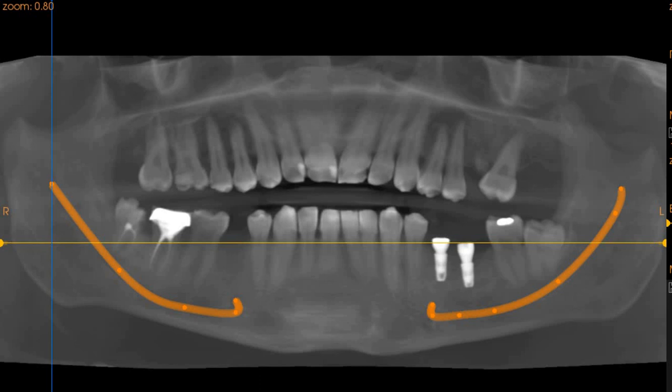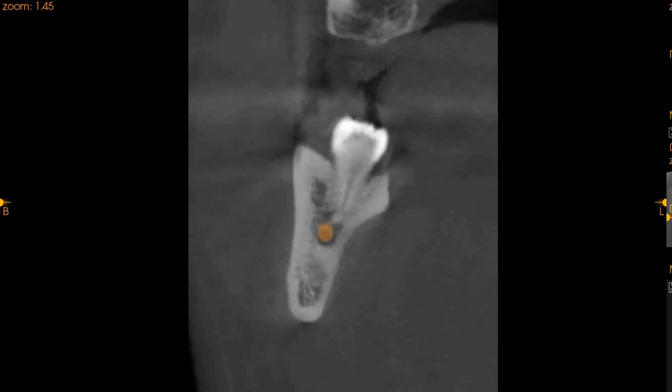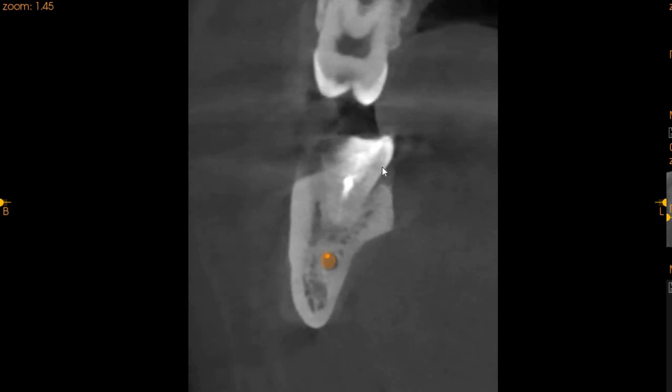Moving to the transaxial view, which is approximately the proximal view of the tooth, I'm going to zoom in for our kind doctor. Now we're going from the mesial aspect. I'm going to slide very slowly to the distal aspect. So this is the tooth. We can see this is the distally carious aspect of the wisdom tooth. Very little crown structure on the mesial side.